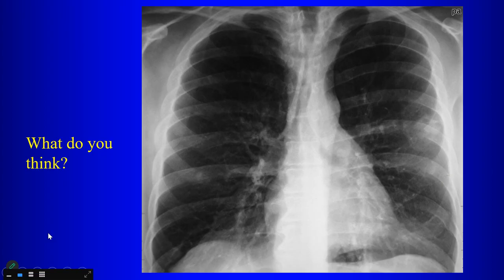Okay, what's wrong with this chest radiograph? Anything?